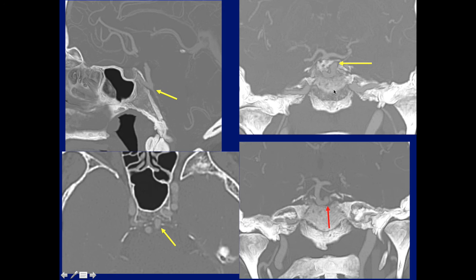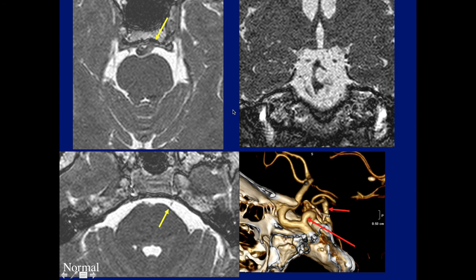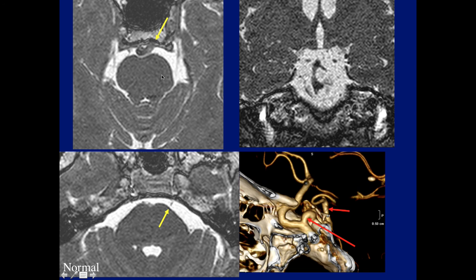Why this patient suddenly developed the 6th nerve palsy is not clear, but there must have been some hemodynamic change. So again, if we look at the diagram, here's the 6th nerve, and again, so the trigeminal artery was within Dorello's canal. And we can see again nicely on the MR, so here's the clivus, here's the region of Dorello's canal, and this is where the trigeminal artery was sitting, involving the 6th nerve. Actually, we can see it here entering into Dorello's canal.